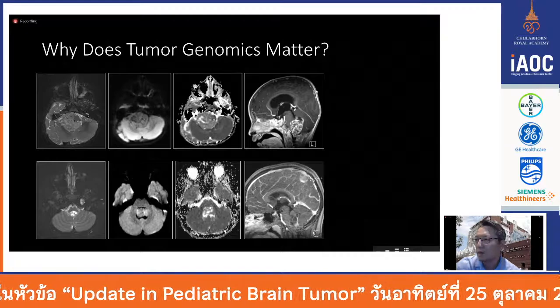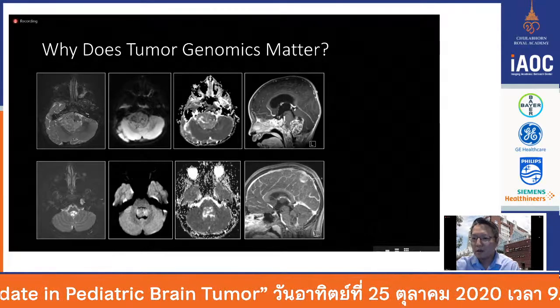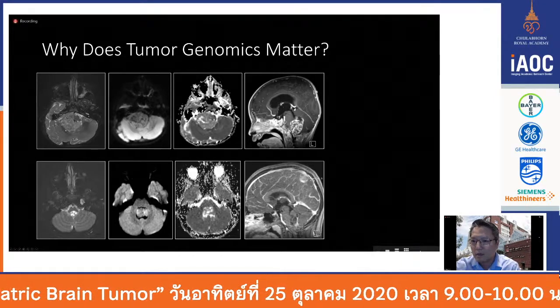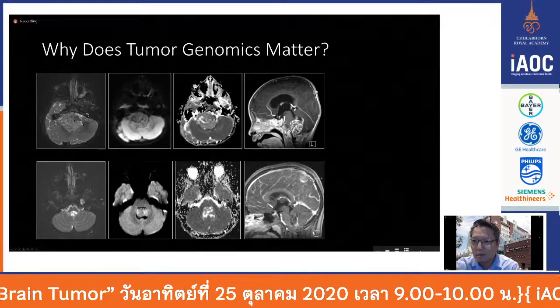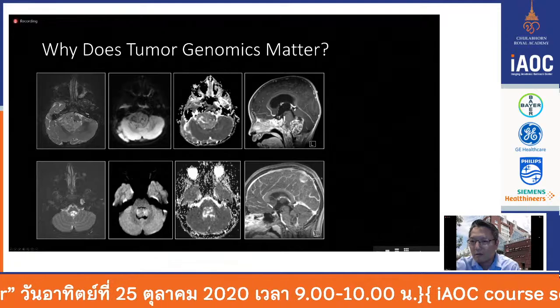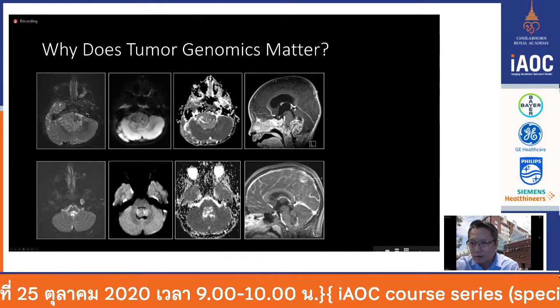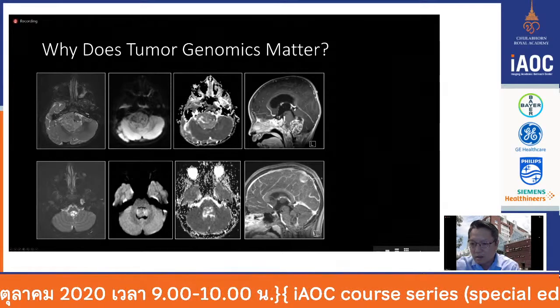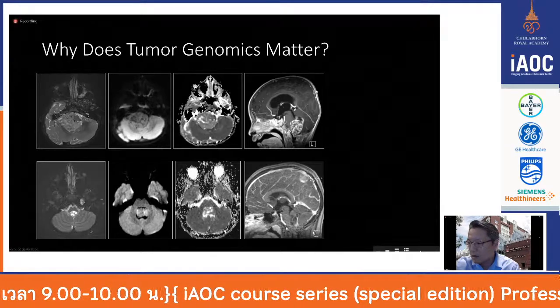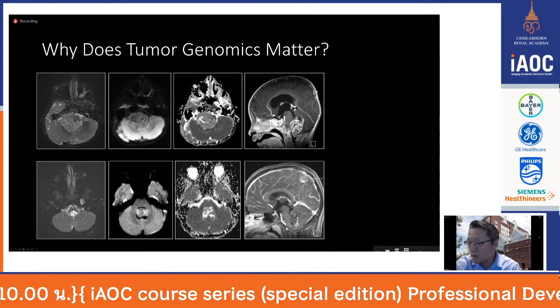And here are two of the same type of histology. However, they also have very different outcomes. Here on the first images, we have T2. This one's a little bit bigger tumor, and you can see that it oozes out of the lateral area here, the foramen of Luschka. And here this tumor is heterogeneous with cysts, but it is in the lower fourth ventricle near the obex, very midline. And then on sagittals, you can see that maybe it oozes down out of the Magendie, so midline.